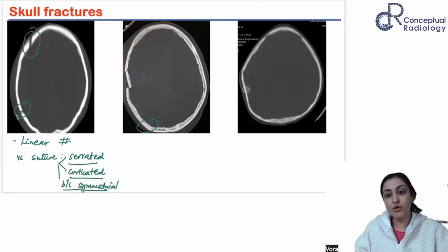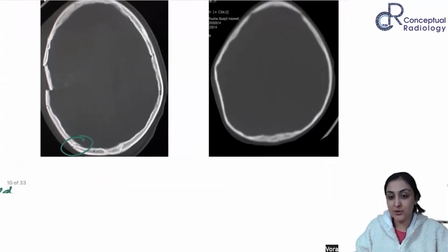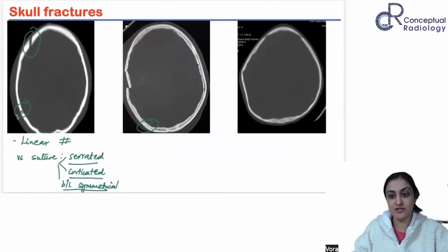So we are talking about bone windows and bone recons, right? This is what a bone window is. If you see this image, doesn't it look higher resolution? Doesn't it look sharper to you, that I can make out the cortex and the medullary junction much better than this one? So are you understanding that this is the bone window, that button you press? This one, correct, is the recon. In the bone recons, which are specially reconstructed harder, sharper reconstructions, you get better visualization of the corticomedullary junction. This is the difference that I was talking about.